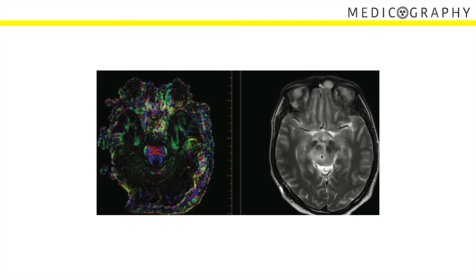Another example of an 18 years old male with diffuse brainstem glioma here. On the MR T2, you can see that this is a quite pathognomonic loop. Axial color map DTI showing loss of fibers involving the right corticospinal tract. You can see it there.